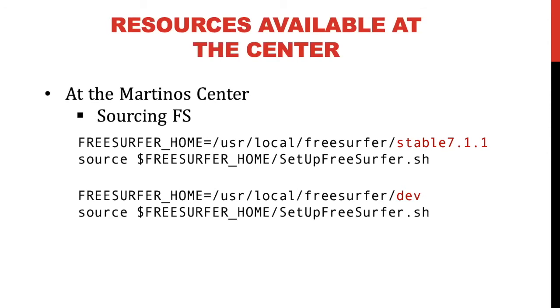And then there's also a dev version. So right now we have version 7.1.1, and it's kind of the stable release that we have. And then you can also source the dev version, which is kind of funny because it was really tricky when I first started this job because I felt like everyone was saying dev all the time, but they weren't referring to me. They were referring to the developing version of FreeSurfer, which is pretty cool because that means you have front row access to all the new tools and tricks and shortcuts and things that our development team is adding to FreeSurfer and Freeview. So I definitely recommend it. It's really interesting and neat to see the new things that they're constantly coming up with.